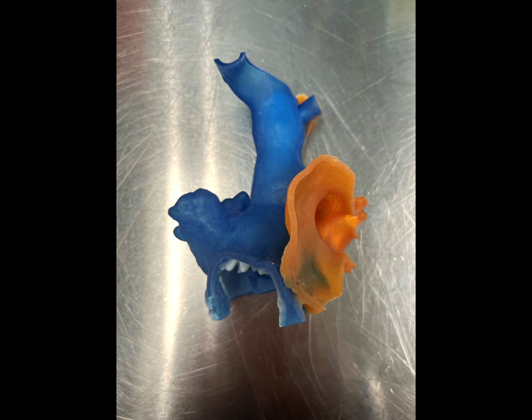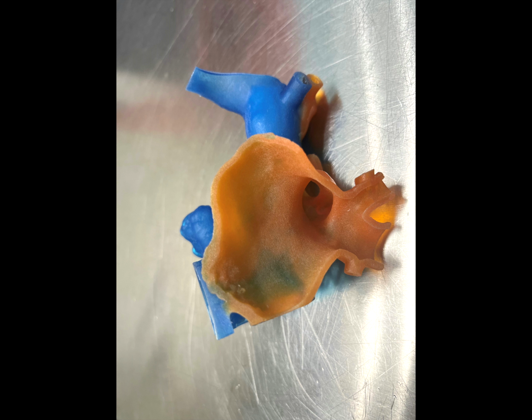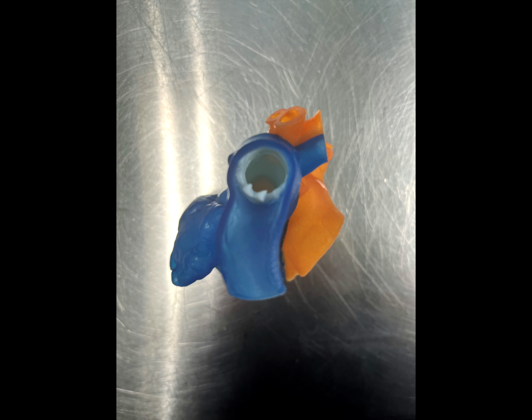Our early experience from human implantation of the VB stent has been extremely rewarding and encouraging. The implanters have felt the ease of use and simplicity of procedure without complications as the most important aspect of the device. We are expecting the device to be available by proper approval process within the next few weeks.